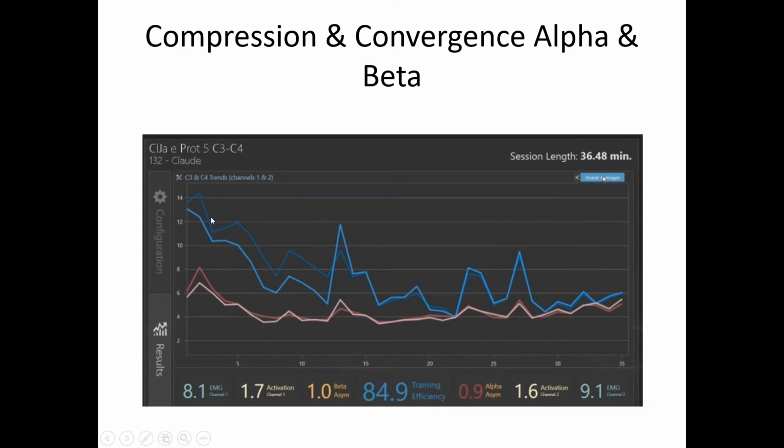So you're seeing this pattern occur, and you can see the phase transitions better on a trend screen. I mean, it's so much more informative. So you see this pattern where the beta symmetry is normalizing and the beta is compressing and everything's going through the same phase transition, and notice beta is going up into a normalization. So the whole brain is doing that.